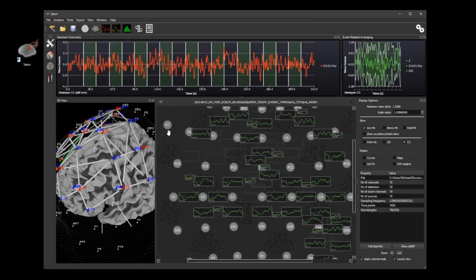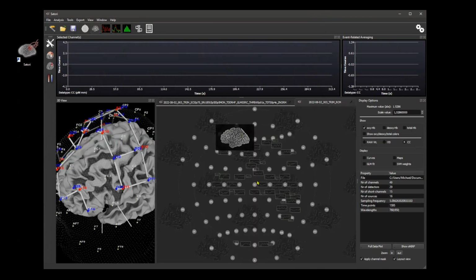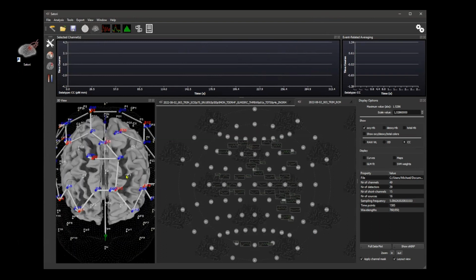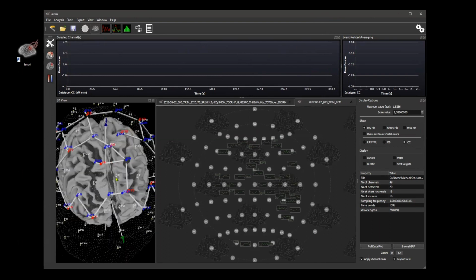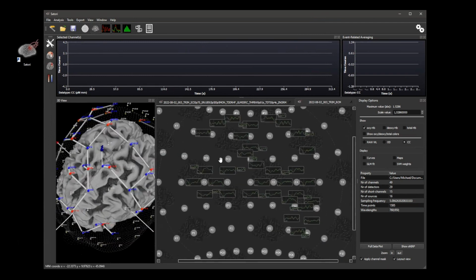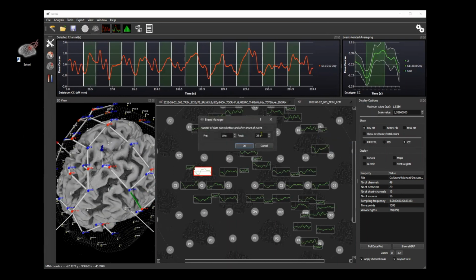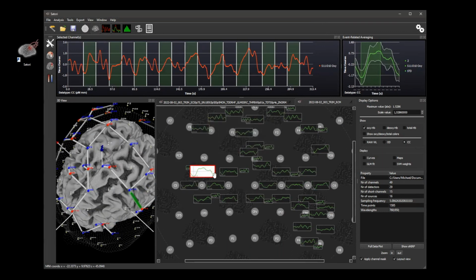And then Satori will save a new data set, which only includes the channels that are not hidden, as you can see now. This you also see here on this view, that a lot of channels that were in there before are now basically removed. And from the preprocessing, we can see now that we also get a nice HRF response. And since we know that the event-related average was a bit longer, it was 32 seconds, we can adjust it here. And then you can nicely see the response in the data, which is directly visible by eyeballing.